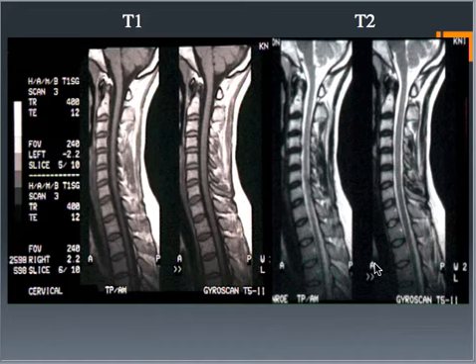Through the MRI image portion of the lecture. So this first image you see here is a T1 image. It's showing the anatomy and it shows the bony detail in better quality. This one over here is a T2, which is showing the pathology a little bit better.